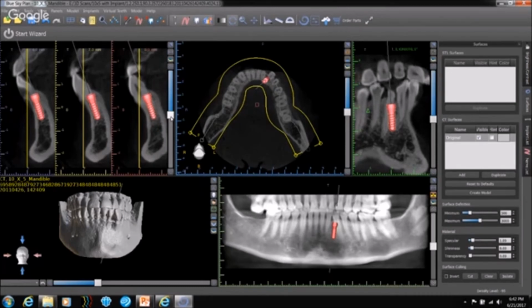Now, I did mention there are a few things to look for always. I do want to reemphasize a few things as we go through the final minutes of this. One is periapical pathology. If the adjacent teeth happen to have any kind of periapical pathology, like in this area, if you look, you don't see anything. The adjacent teeth are pretty healthy. So if there's any periapical pathology, please be careful that unless and until that is taken care of, you might have issues even if you do any kind of implant planning in the adjacent areas.